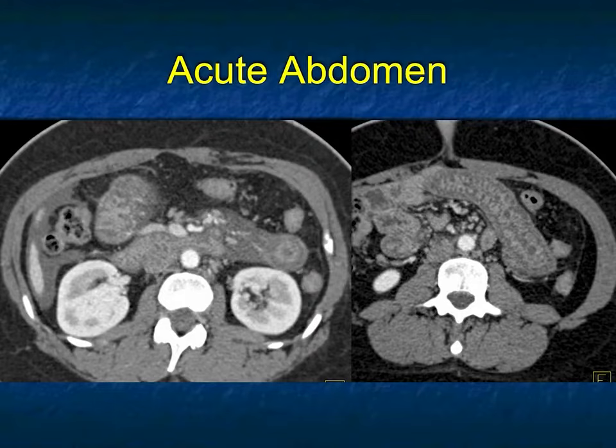This patient has acute abdomen, and what you notice is ascites, but also this impressive thickening of jejunum. It really is edematous folds with prominent mucosal enhancement. It looks like edematous folds. So you could think about, could this be tumor like lymphoma? Could it be some other tumor? That's a thought. Could it be an ischemic bowel? The vessels look okay on the images we see, but ischemia is still going to be a definite possibility in this case.